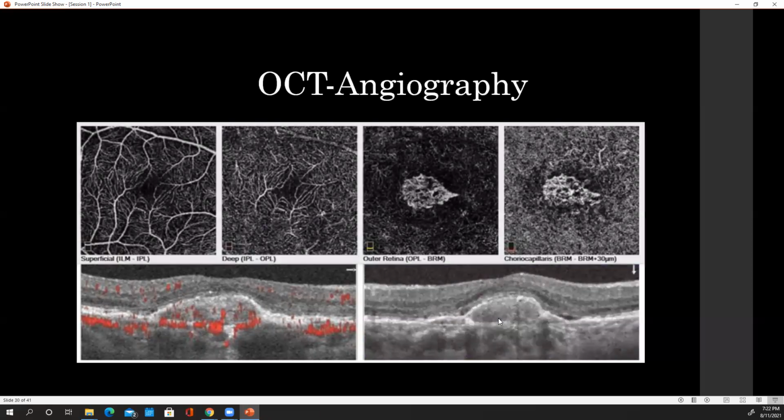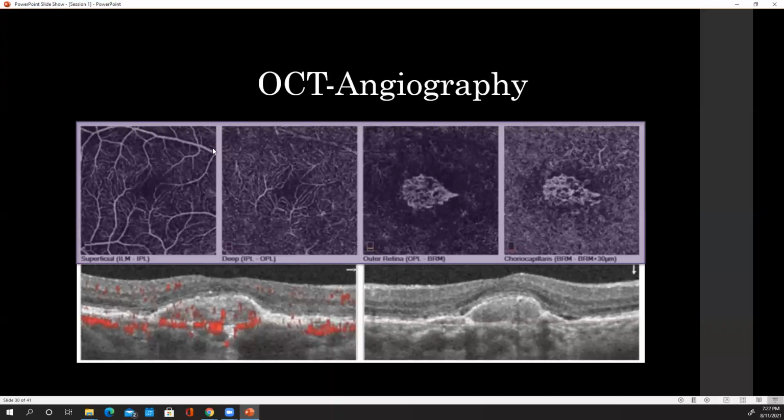Okay, so then you say, all right, now I'm going to look at these cuts. Now, these cuts are what are called en face. It's almost like the fluorescein angiography, except we're not doing fluorescein angiography. We've done the flow thing, right? So we light up places where there's vessels because that's where flow is actually really heavy. And then the other places where there's not lighting up, it turns out that it follows the pattern of the vasculature, which makes complete sense. That's where all the changes you would see are, right?